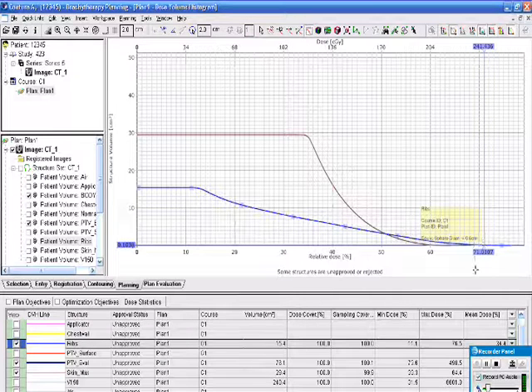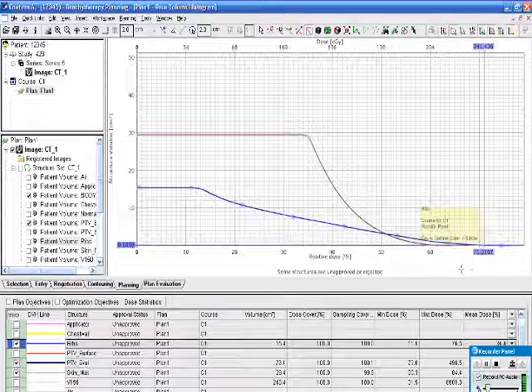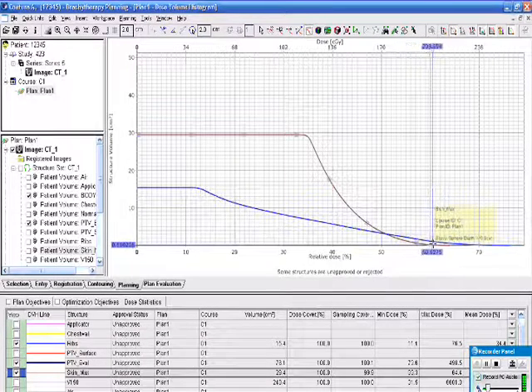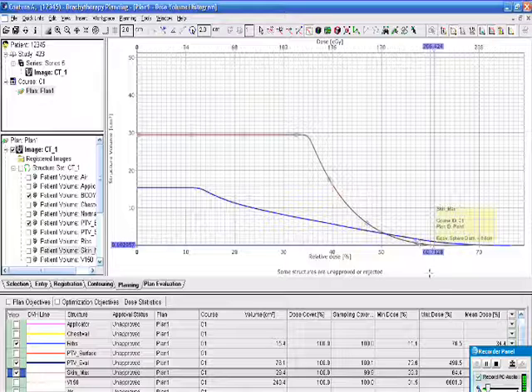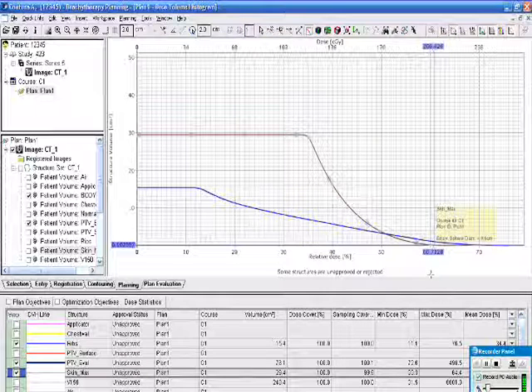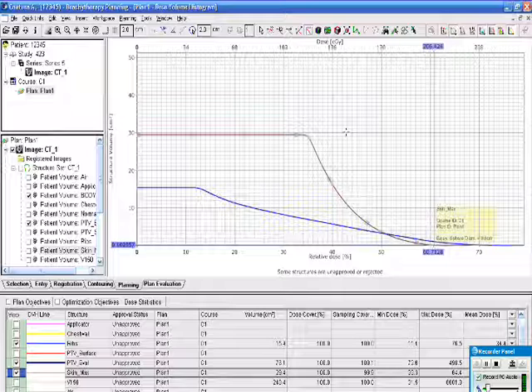Like that. And so here's the maximum rib dose. It's 71%. This is not even interesting. It's so low. Let's try the same thing with the skin. And we'll drag that over here till we see 0.1 cc over there. And we have 60.7%. Again, in this case, it's not at all challenging. These are not going to be limiting us in any way. So we would like to make a little bit of adjustment in this plan just to get slightly better coverage, but we don't need to do anything more beyond that.